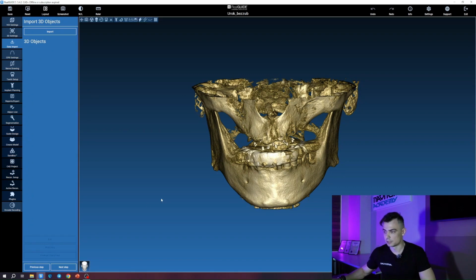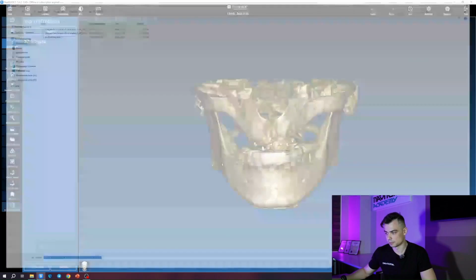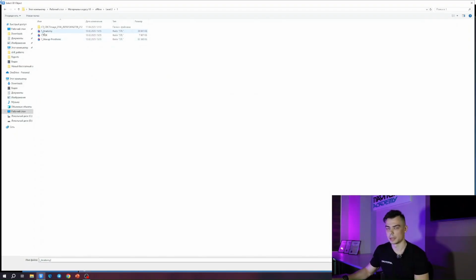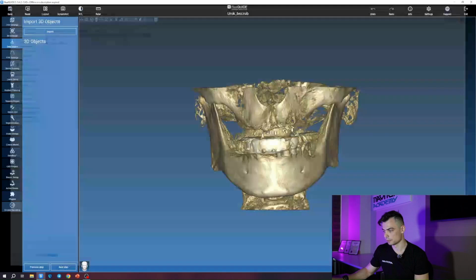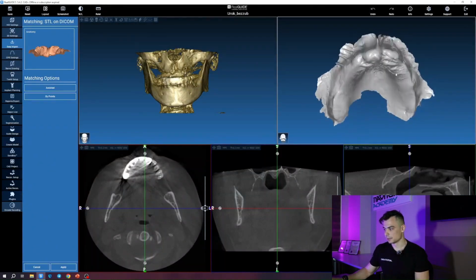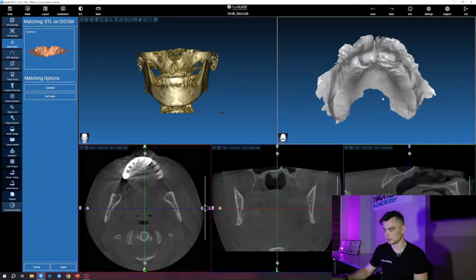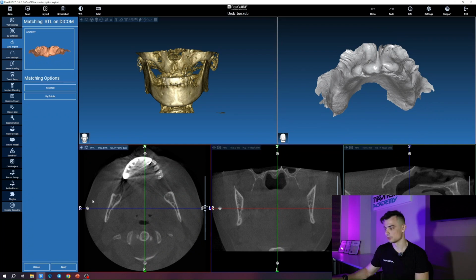In any case, I've just clicked through 2 steps to reach the data import stage. So now we're going to import data into the project. There you go. And we have a scan of an Edentulous jaw, which we're going to upload as the anatomy. Here in my folder, I have this anatomy file. So now I'm uploading it. As we can see, it's basically this kind of file. So this is a scan of an Edentulous jaw.